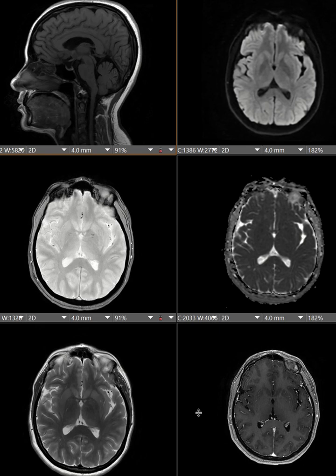Today I would like to discuss with you guys a very common entity that has very interesting and classic imaging features that we all need to get familiar with. If you're a general radiologist, it's a must know for you guys, and if you're not a radiologist, it's definitely your day-to-day working case that you're going to encounter. And if you're a patient, these are important imaging features and verbiage that is going to be in your reports, and you can get familiar with and learn what these things mean.